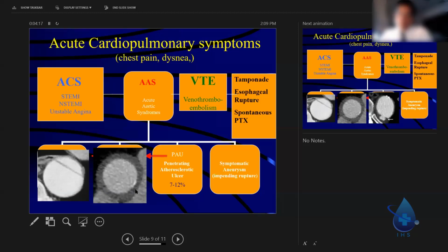Would a difference in Hounsfield units help you at all? Yeah, it's funny you say that, because in the radiology textbooks they put a lot of credence into that. They say check the Hounsfield units right here. I'll tell you, I don't think it's good enough to hang a man's life on. I'll measure it, but I don't believe it, because technique of the CT scanner can change that. So no, I don't believe it too much. I do it just out of interest, but I've never put any stock into that.